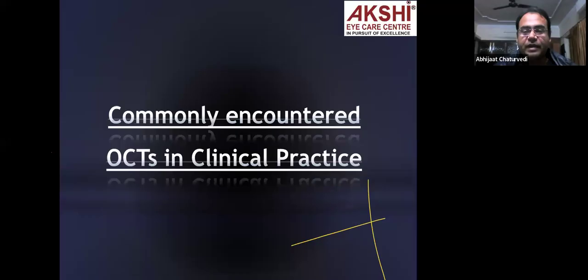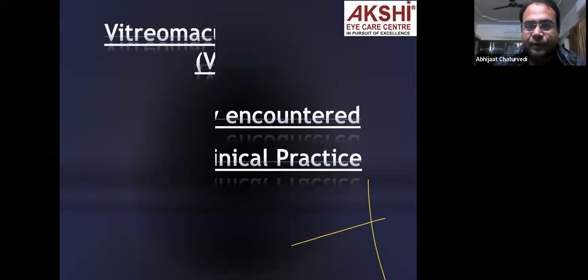Now, there are commonly encountered OCTs which I'll be discussing and showing you. Try to combine the things which I have imparted to you till now and try to find the findings before I tell you. I'm very sure that if you combine your basic knowledge, you will definitely be able to catch the details here.